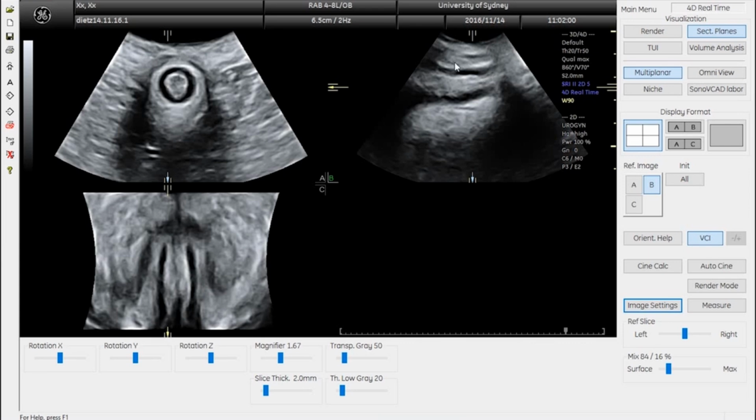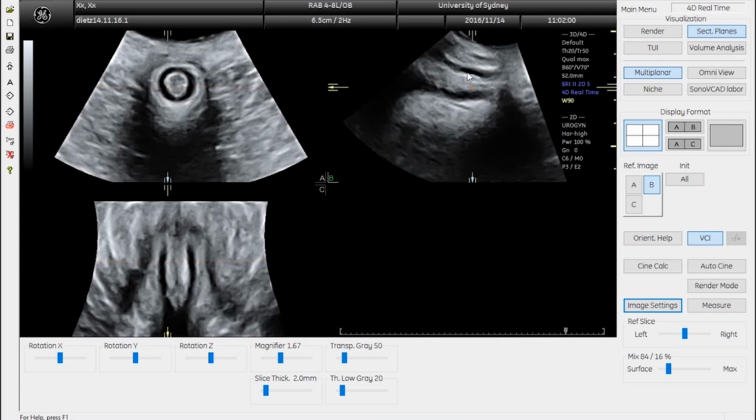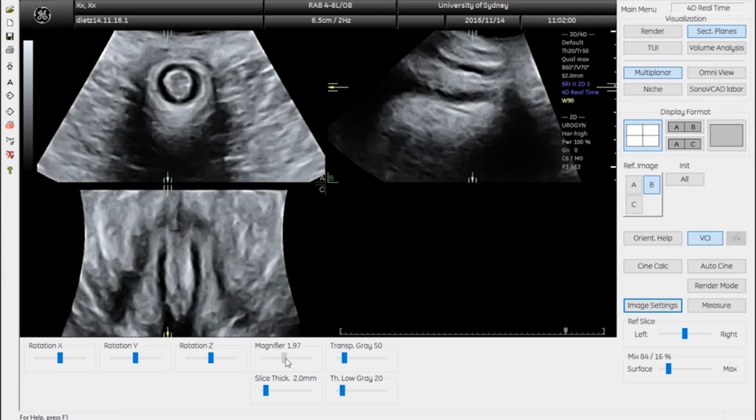And of course, you never know what's happened here in somebody who's para. It's just that here in the back, nothing would have changed since birth unless there was a major colorectal intervention, which you'd hopefully know about. We then rotate the mid-sagittal plane in order to make the internal sphincter, this dark stripe here, more or less horizontal, and that's probably just about right. We can enlarge it a little, and then that particular plane is our reference plane for the tomographic assessment.